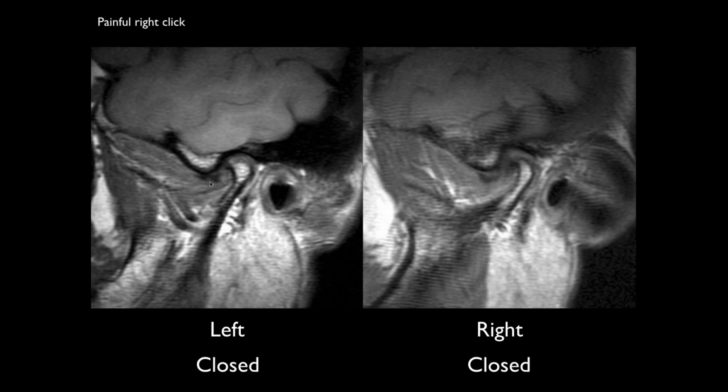See the anterior part of the disc, the central zone, the posterior part. And here also, the morphology is a little bit more abnormal on the one on the right. It's anteriorly displaced. There's some kind of mass effect here. But notice that we don't see the normal soft tissues up here. So what do you think has happened here on these temporomandibular joints?